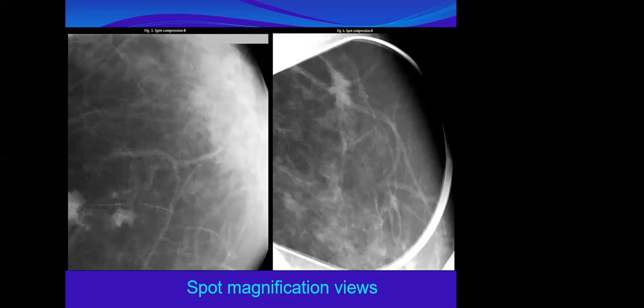The difference between multicentric and multifocal. Multifocal, usually it will be multifocal within the same quadrant. Excellent. Or less than 5 centimeters between the two lesions. Excellent. Within 5 centimeters from the index lesion or same quadrant. If it is in different quadrants or more than 5 centimeters distance, it will be multicentric. And what is the impact on the management of the patients?